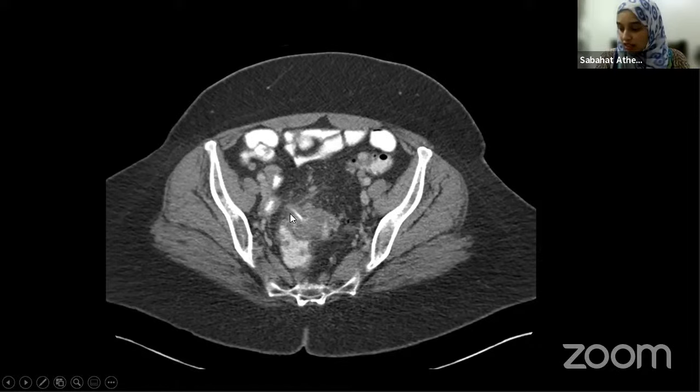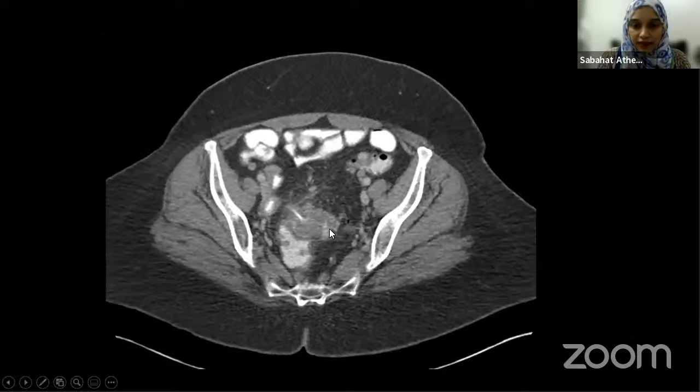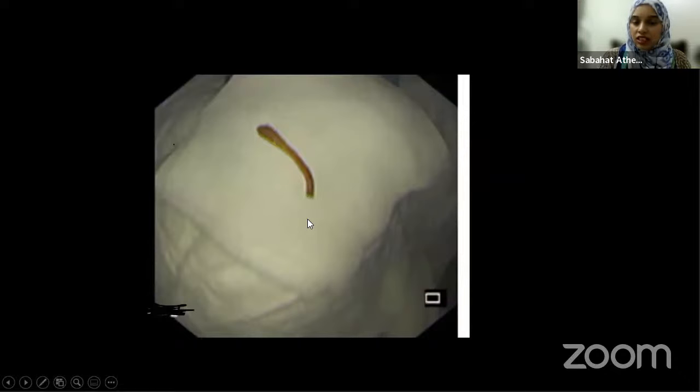No, there is no fistula. This was a male patient, so no IUCD. Can everybody agree that there is a linear body here? This was a linear foreign body in this patient. The patient had diverticulosis, he had diverticulitis, but it was complicated by the foreign body. And this patient underwent colonoscopy, and what they took out was a chicken bone.